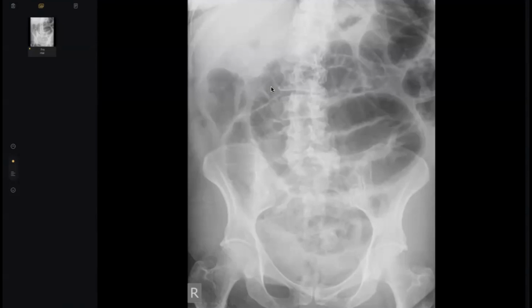Age of the patient, he is adult, by the way. Okay, sir. So I'm suspecting a small bowel obstruction. I want to check the erect view of the chest to look for air under the diaphragm to confirm my finding about the complication of pneumoperitoneum. This is the only available view. Okay, so the small bowel.